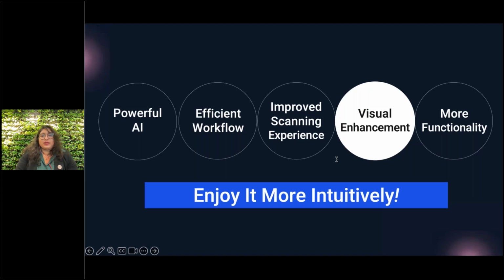Our fourth key point is visual enhancement. With some of our new visual enhancements, you can enjoy an even more intuitive user interface.